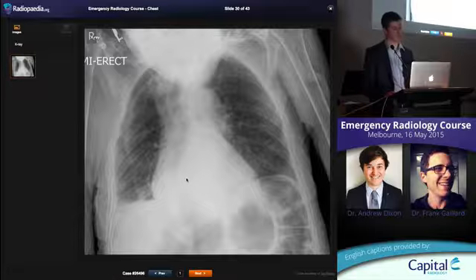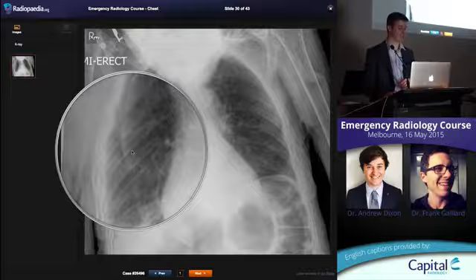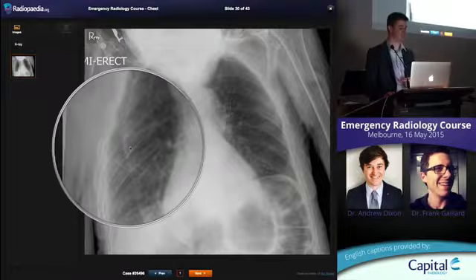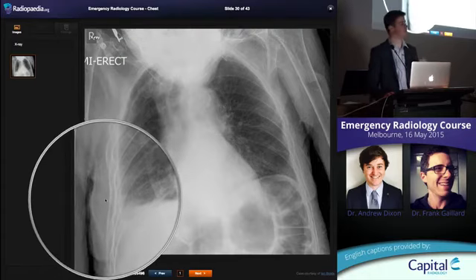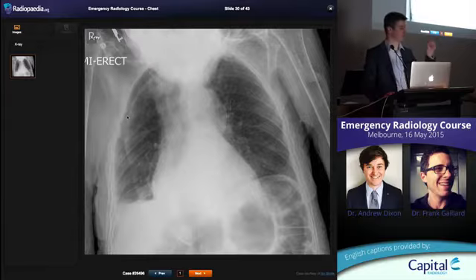This patient might be mistaken for having a pneumothorax because you can see this line coming right down the edge of the chest. But as I said before, it should be air on one side and then a very thin line and then air without any vessels. You can see vessels beyond this, okay? And you can see this line kind of gets dense. It's quite thick, dense line, and then it suddenly stops. That's a skin fold. So the patient's lying there and they've got very floppy old person skin, and it's creating that artefact on your film. So not to be confused with a pneumothorax. But go back to the principle of air on one side, air on the other side, very, very thin, the pleura is tiny, okay, and then no vessels beyond it. So not a pneumothorax.